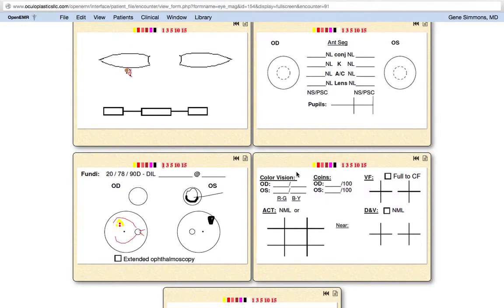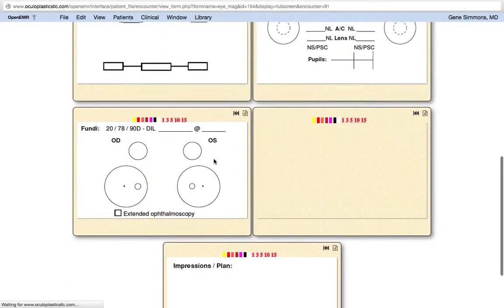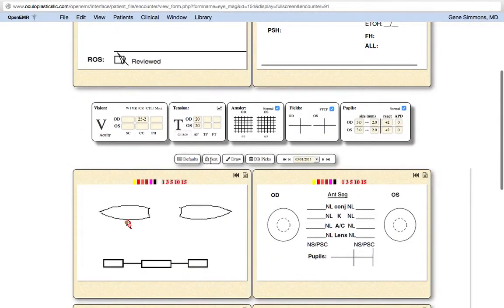From a user standpoint, each time you click down, the image is stored. If we refresh this page and look again, you'll notice that it wasn't saved, and that's not supposed to happen. Let's see if it did get saved. It's just the server was lagging behind. Yeah, there we go. It was saved. That was a little too quick. Happening in the background, every time you lift up the pen, the server's being contacted and updated. Let's go back to the text version of this.